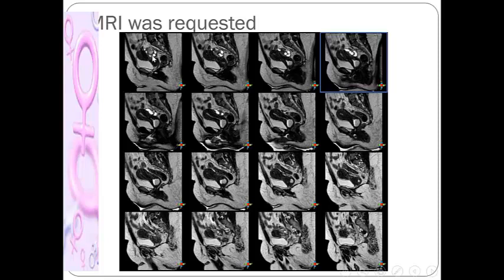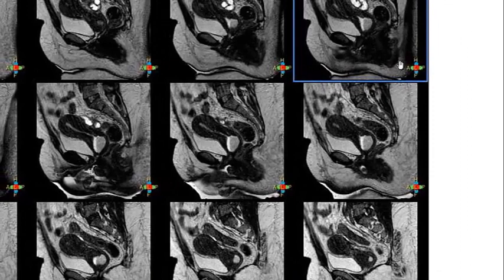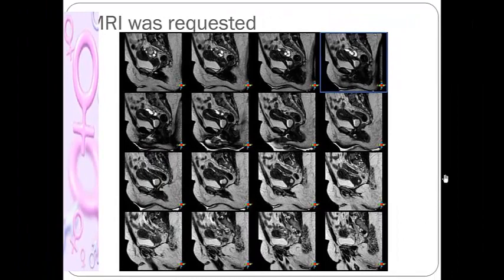This is the ovary. And here, this is the uterus. There is a cystic lesion present within the cervix, inside the cervix. And then we could not see a proper vagina. Here, we could not see a proper vagina. We see just a vaginal pouch here. And here, the cystic lesion is not coming. So it was very unusual, especially as this patient was 40 years old.